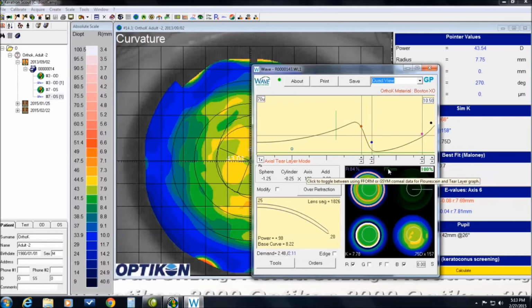And I'll go back to the symmetrical mode and again inspect this. That's about 8. This looks pretty good. I'm kind of liking the way this all looks, so I'm going to go with this design.